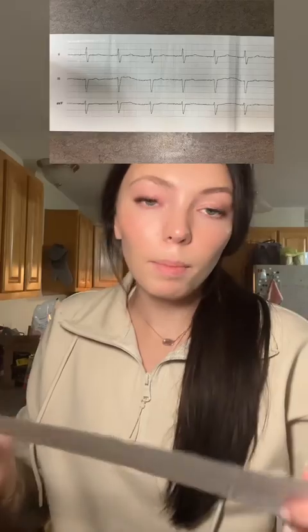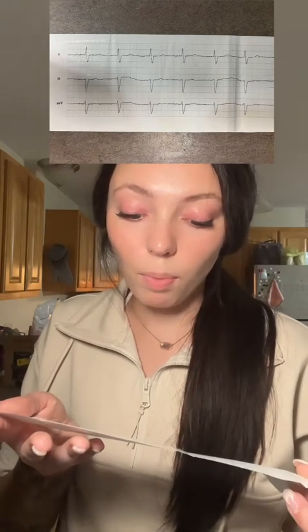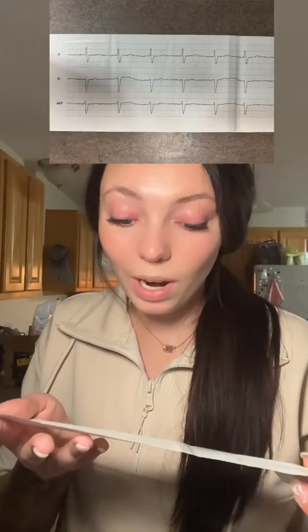so this is actually a little slow. Is this regular or irregular? I don't have my calipers or anything, but this looks pretty regular to me. Is this wide or is this narrow? This is actually borderline wide. And the way I say borderline is because we are cusping about 2.5 boxes on my complexes. And as we talked about, to be considered wide, it's going to be 3 little boxes. So far, we have figured out it's a little slow, it is regular, and it's borderline wide.